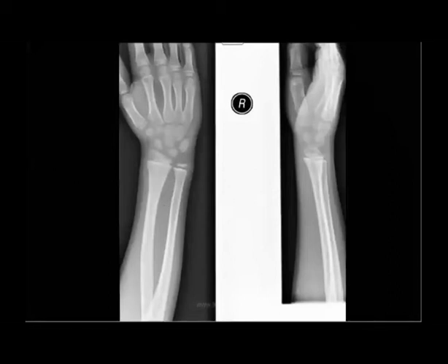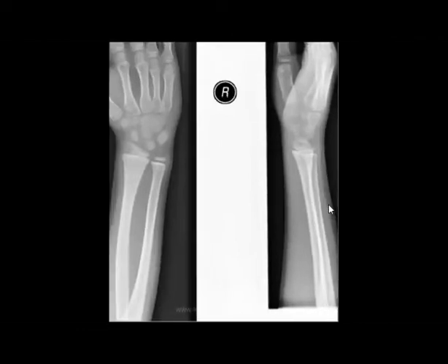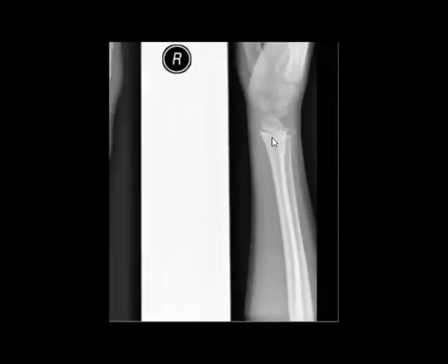Sometimes it can come to you as something subtle. It's very subtle in the rapid reporting, but you may need to zoom in. I will try to show you. For example, if you zoom in here, you will find that yes, there is something going on here.